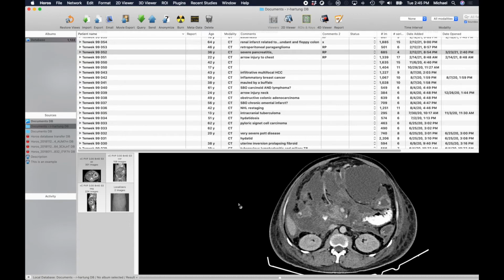So that concludes how pre-work can include scrollable cases, and now I want to show you a technique for scrolling through the cases yourself as the presenter. While I built this particular talk using Radiopaedia playlists, I want to first start with a more familiar and intuitive step of putting scrollable cases directly into PowerPoint presentations.